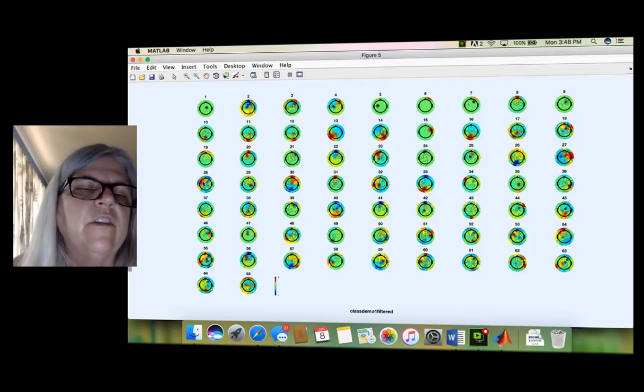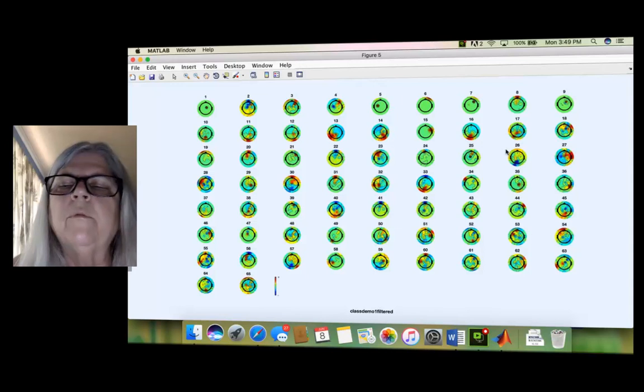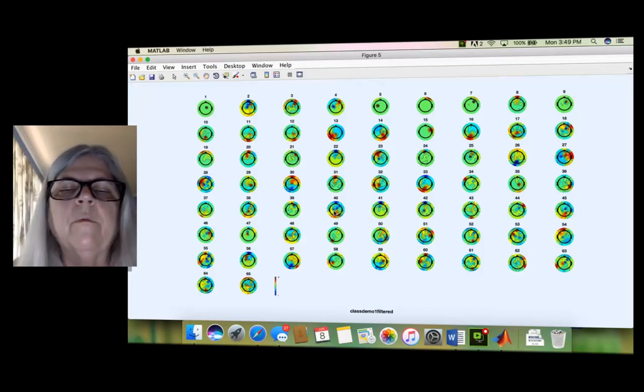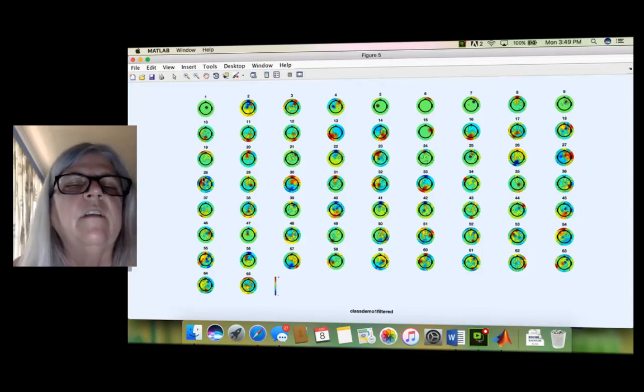If you look here at channel 28, channel 38, really most of these channels, probably from 26 and up, are the way it would look if you had a region of your brain. Say if we look at channel 40, this is your visual cortex here. Clearly it's active, and so channel 40, yeah, that's probably EEG. Channel 30, this is your right frontal lobe. Yeah, that's probably activity in the right frontal lobe. This is your left temporal. Yeah, probably activity in the left temporal.